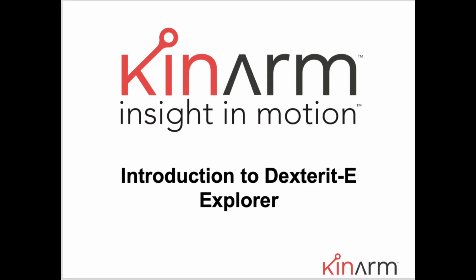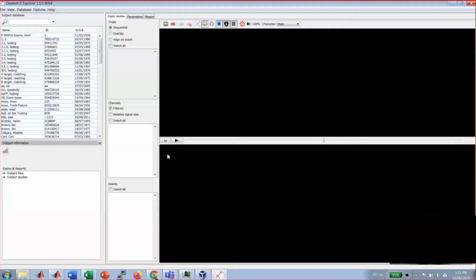So first, in case anybody hasn't seen this yet, especially people new to Kinarms, Dexterit-E Explorer is free software. It's available to you from our website. It runs on Windows and Mac. You can run it on as many computers as you want.